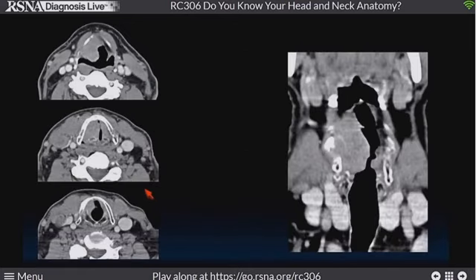Now this is how we describe tumors. So if you see fat, you know the tumor is above the level of the ventricle. Here you see it's below, and here it's going down into the subglottis. So fat to muscle with our marker slice, thyroarytenoid muscle, cricoarytenoid joint. This is the upper part of the cricoid. That may be important later. And here it's down into the subglottis.